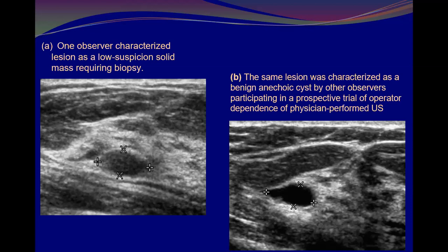So we said it has to be optimized to have an optimum contrast, not to be an over hyper contrasty image, black and white, and not to lack the contrast. If you look here, there is lack of contrast. Everything looks the same, and even the resolution is being affected.